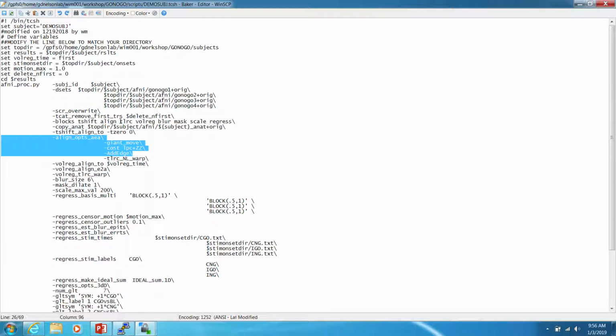And then this step is just taking the functional images and sort of mapping them onto the structural, right? So it's already gone through the TLRC, right? I think that's actually the next step. Oh, okay. Yeah. No, it's okay. That does happen, but that goes a little bit later, I think.